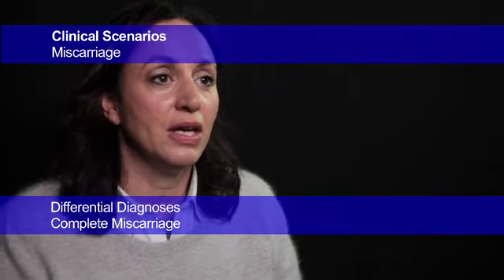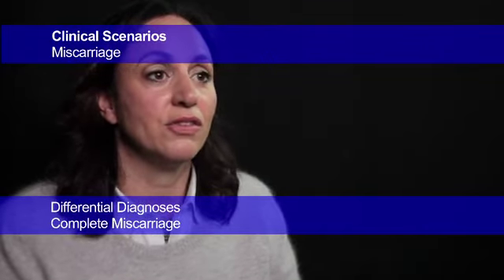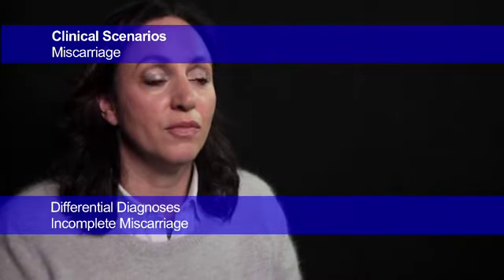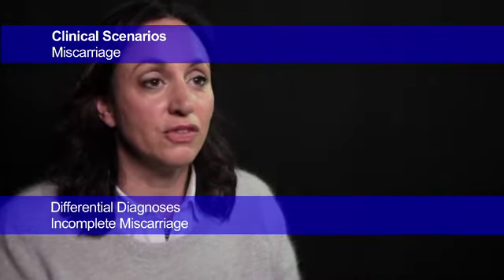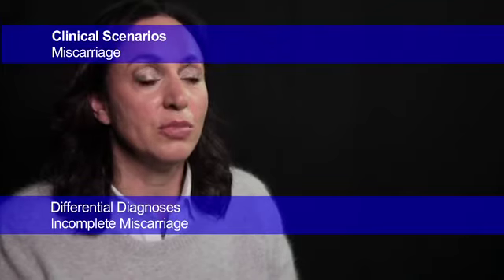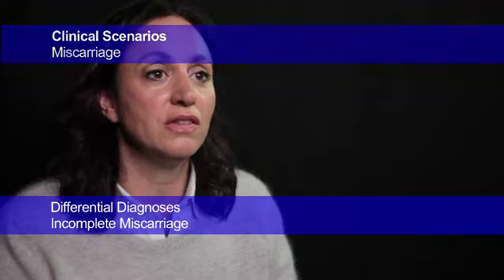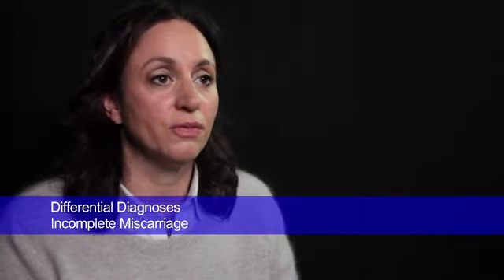Conversely, in the scenario where the miscarriage has happened, the fetus is no longer viable, the bleeding has commenced, tissues of conception have been expelled, but on ultrasound we can still see evidence of retained tissues. This is described as an incomplete miscarriage.